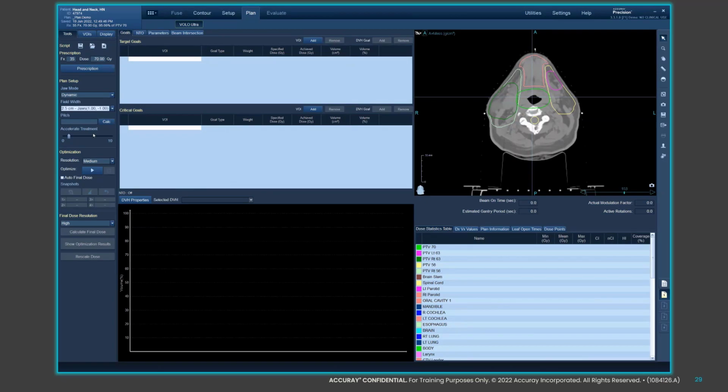So for the automatic pitch, when you click on this calc box, your pitch will automatically be populated to correlate to the target's off-axis measured distance. And this is using the information from the Chin paper, as some of you are probably familiar with. So when I click on calc, it will default to the 0.4 range.